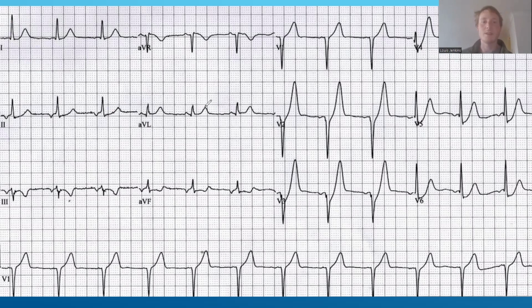And then when I look at AVL, yeah, the amplitude of the T wave is actually kind of concerning here. And you might be like, well, actually, that T wave isn't that big. But when you compare it with the size of the preceding QRS complex, that's when you might think, oh, okay, actually, relative to the amplitude of that preceding complex, the T wave is quite large. And that should be a little bit alarming.